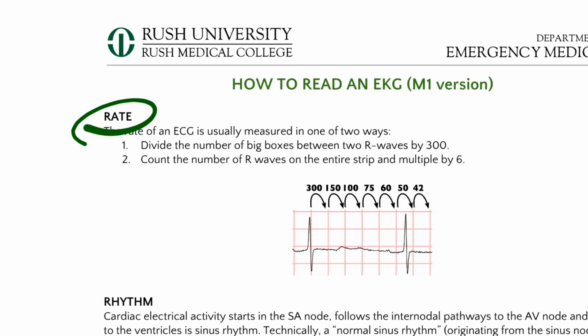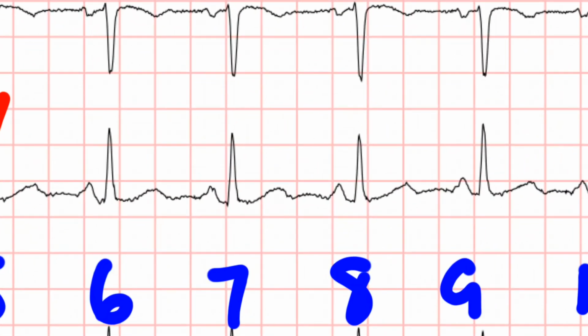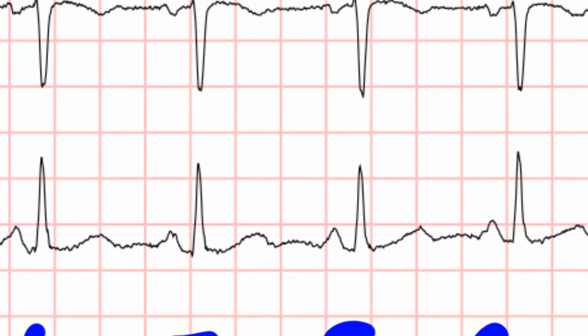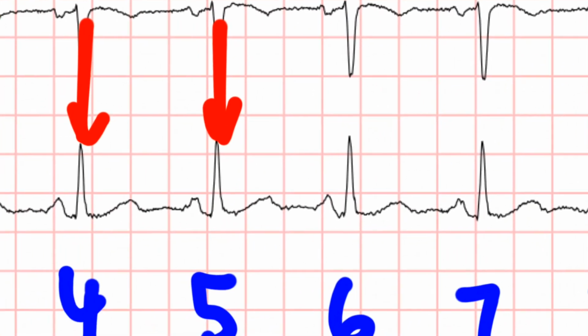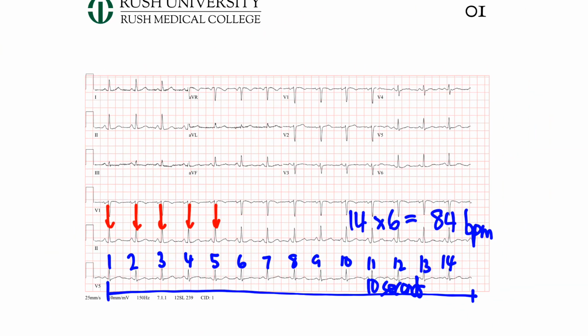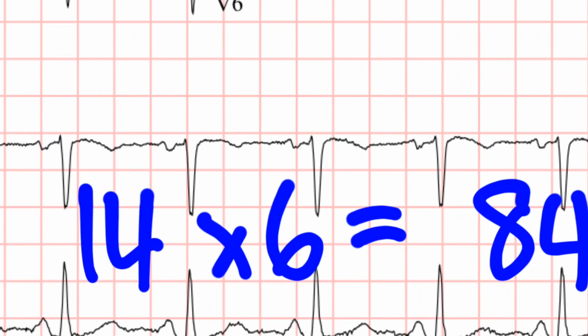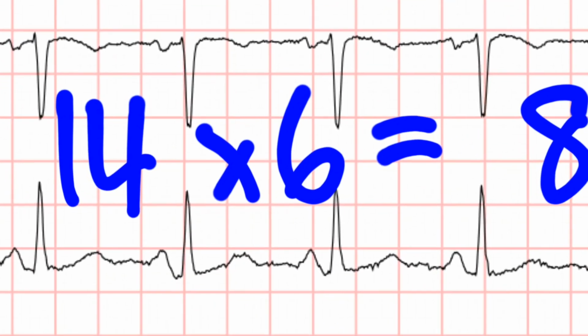Let's go to that initial EKG we looked at. Okay, here. So let's just zoom in real close here, and let's do the same thing. So let's find one that falls on one of those lines. I'm sorry if I'm giving you vertigo here. Here we go. This one does. Right here. Okay, and I'm going to use a red color.